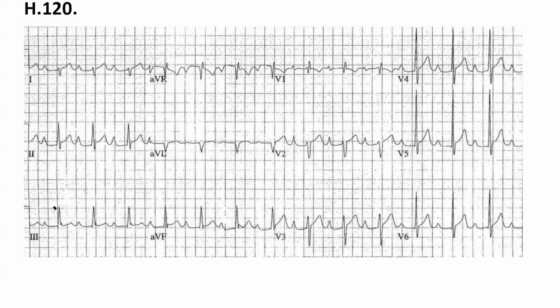So we've got the P wave as well. Yes, we do have P waves, but they seem to be a little tall. So, right atrial hypertrophy.